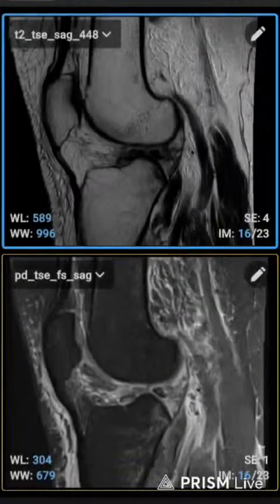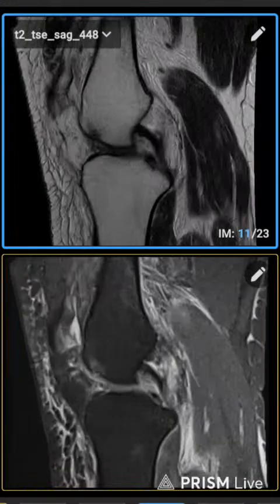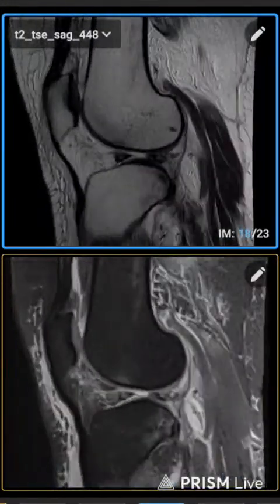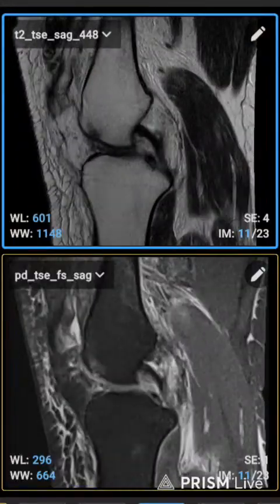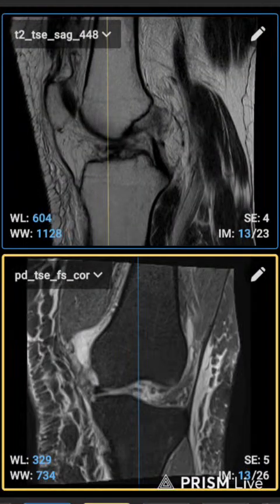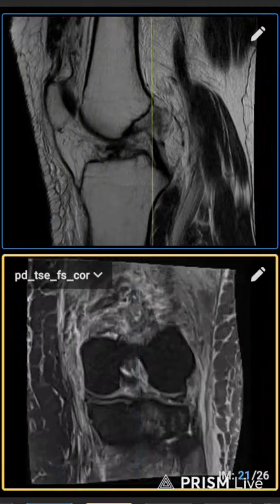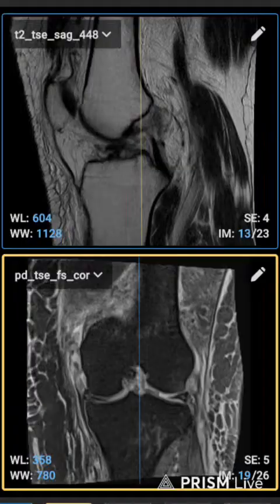If you see in this area totally it's a fluid or infected fluid, or edema, so it was showing in PDFS properly. So lots of the sequences are differently showing the fat suppressed, so it's properly identified if there was anything.